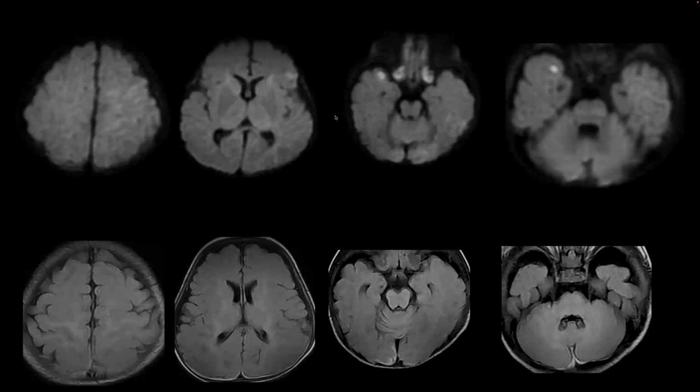Okay, so quickly, the first MRI, on top of the diffusion weighted sequences, you can clearly appreciate the cytotoxic injury in the basifrontal regions on both sides, and the anterior temporal lobe on the right side. But I don't have the ADC sequences to compare the diffusion abnormalities. Overall, the diffusion in the brain itself appears slightly hyperintense, especially the deep brain nuclei, the thalami, the caudate nucleus, the central white matter, and also the periventricular white matter is slightly hyperintense. ADC would have been helpful to confirm if these are actually areas of restricted diffusion.